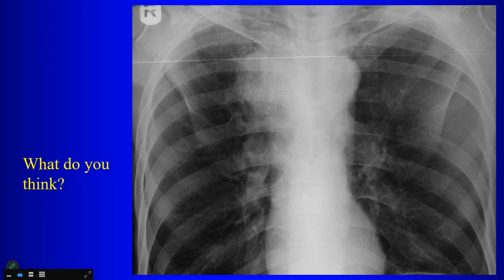Yeah, so it certainly could be lymphadenopathy, right? The most common cause of a paratracheal mass might be lymphadenopathy, so you're certainly concerned about that. Of course, we are here discussing lung cancer, so first of all, what's your differential for lymphadenopathy? Lung cancer, what else?